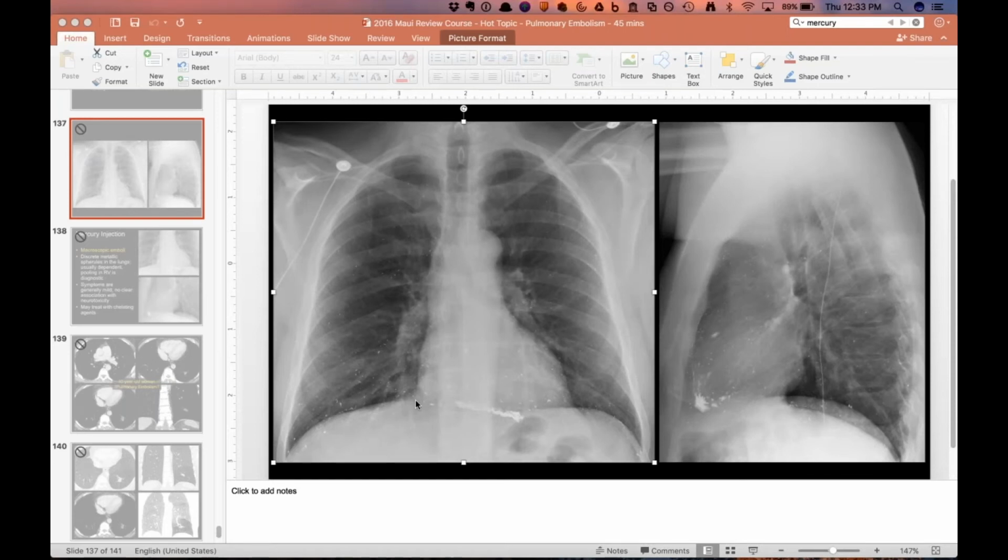Okay, really quickly, we will revisit this. This is the case I have from St. Louis of mercury injection. And yeah, it's the same tiny little punctate metallic fragments and then the stuff that likes to accumulate in the right-sided heart chambers. So I think that's a useful clue in these cases, since it makes sense it has to get to the lungs via the right ventricle.